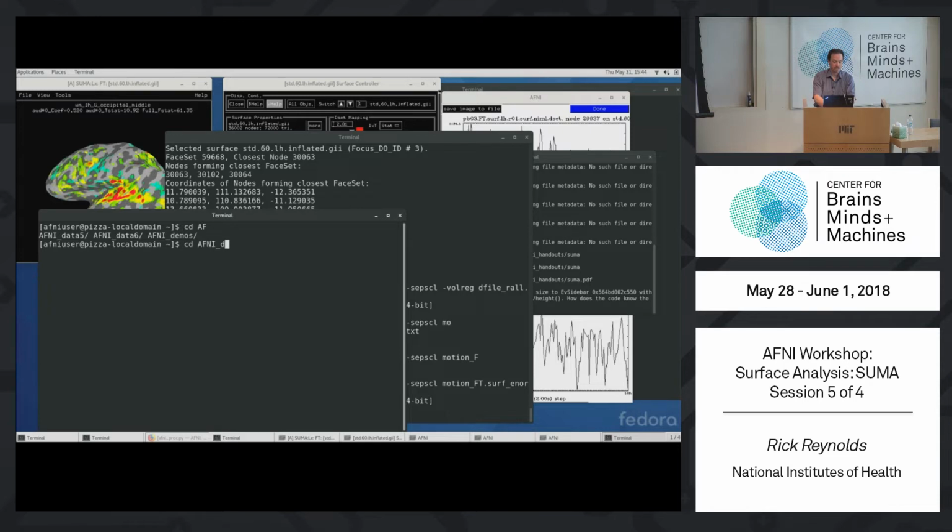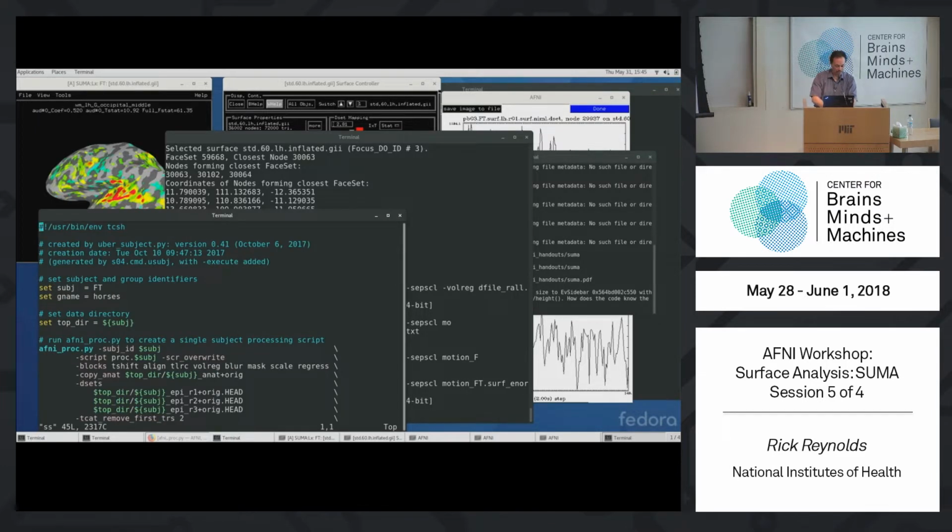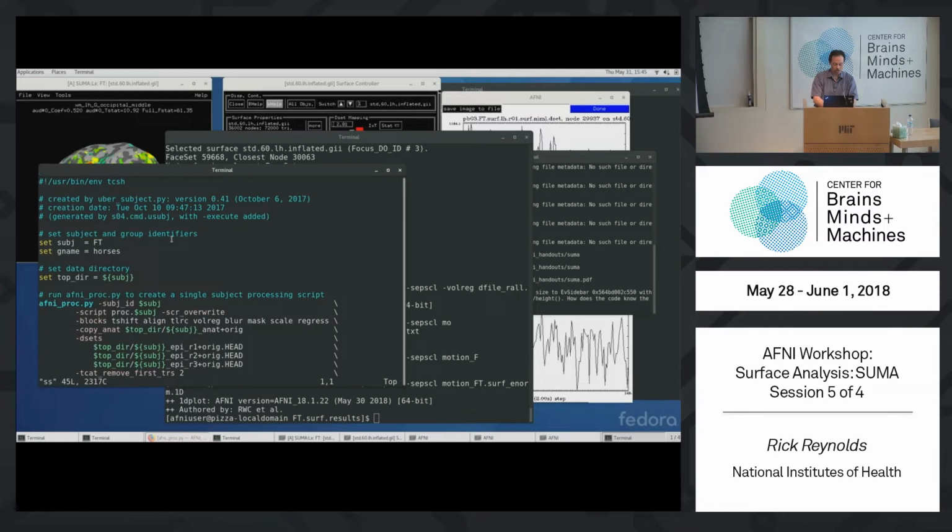I'm going to cd into AFNI_data6/FT_analysis again. I'm going to copy s05, how do you spell s05? Copy that to SS. Fine, wonderful.